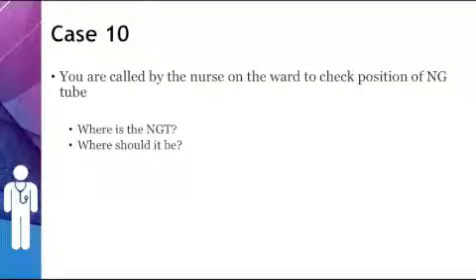So, last case, you're called to the ward to check the nasogastric tube. Where should the nasogastric tube be and where is it in this case?